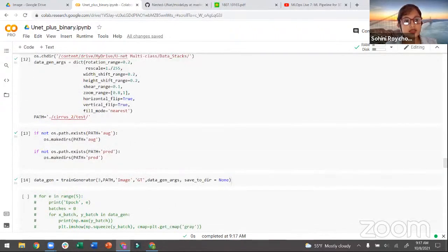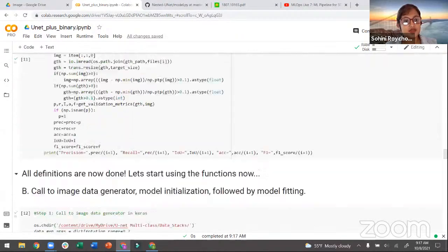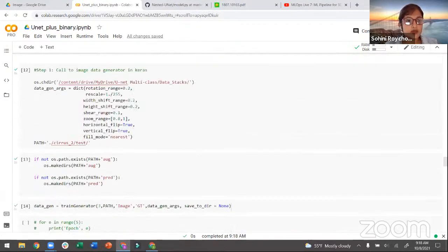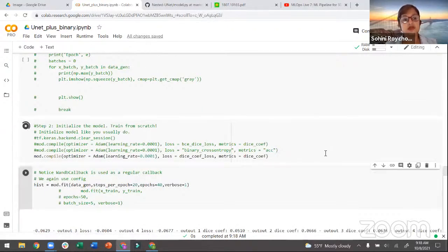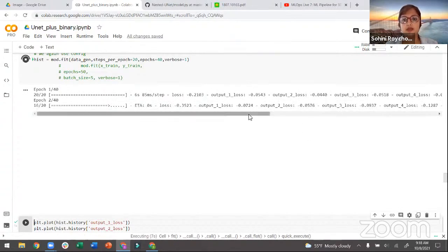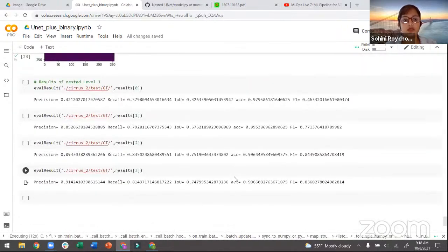So let me initialize this back. And this is a good debugging exercise for us anyways, right? So I'll have to first reinitialize this. When rerunning something, you should always start from reinitialization. Otherwise, it will assume that the point from which you're starting is just the previous location, and it will restart from there, which is not going to be accurate. All right, so this is going to keep going, and once you have seen the loss functions, we will be able to look at what the outcomes are.